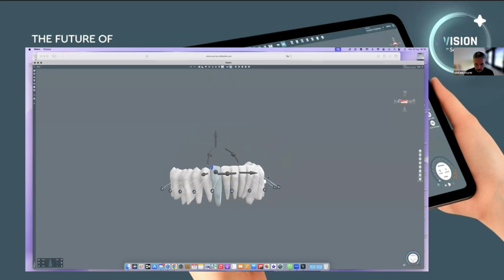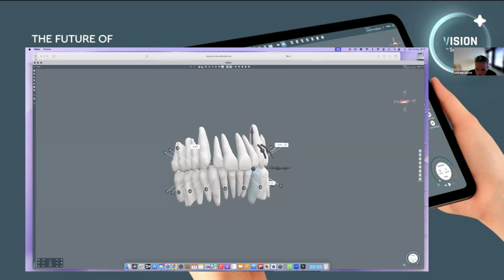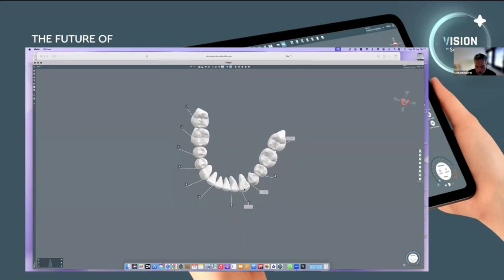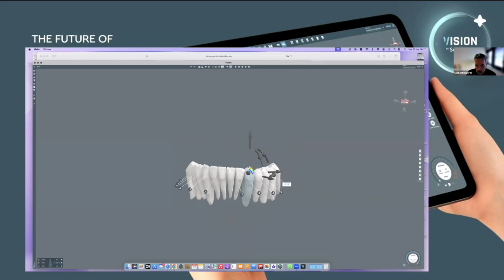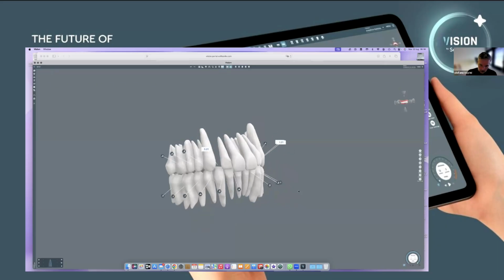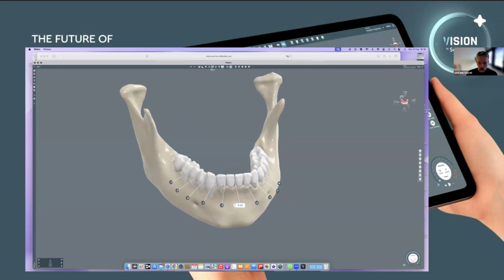Move a little bit. I go forward. Every time I change the axis, I check the relationship, because I like to add a lot of different types of movement in my box, and just to check this one.